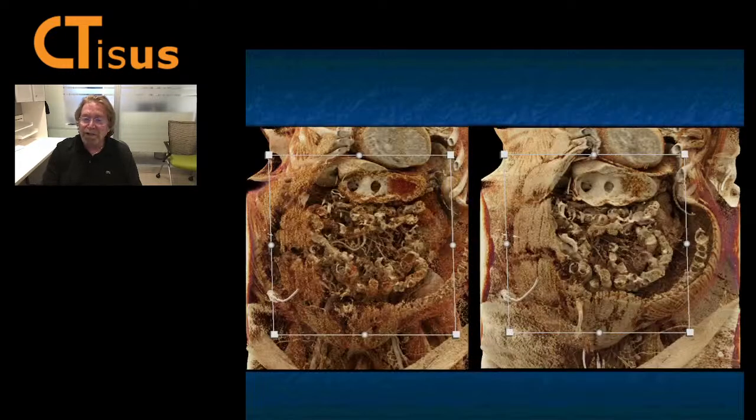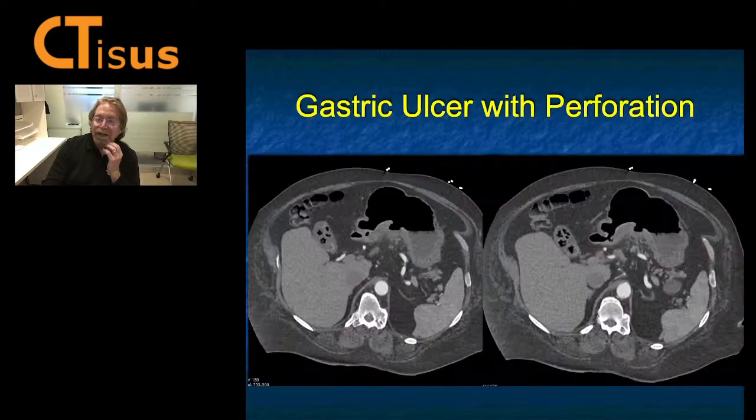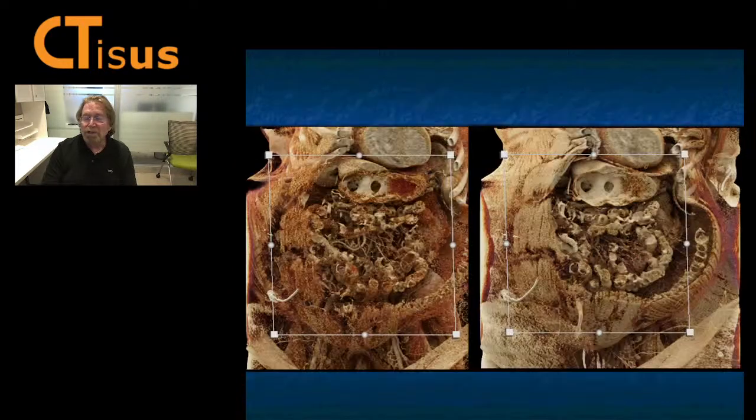Now look how nicely you can see we're looking into the stomach as if we're inside the body of the stomach. You see the posterior ulceration, the diffuse wall thickening. And again, you make your consideration. This patient will end up with endoscopy, and this was a benign gastric ulcer. Beautiful example of an ulcer, beautifully shown on the cinematic rendering. Just a really, really nice example.